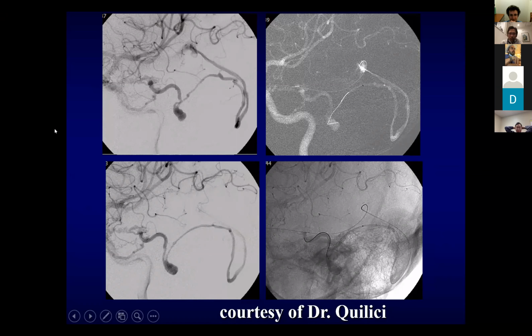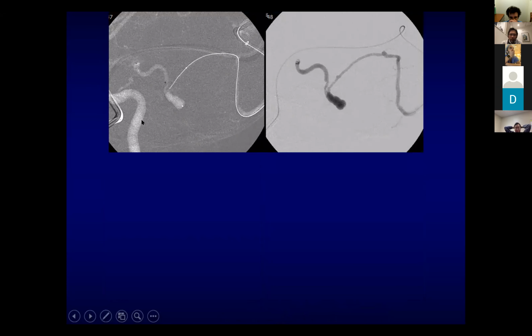One comment about why it looks like that. Where you see that out-pouch, that sort of venous ectasia, I think there was probably another venous outflow that got occluded, and so the fistula found a collateral venous outflow through this cerebellar vein. This is my interpretation of this image.